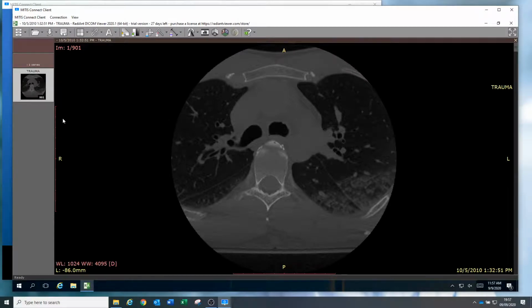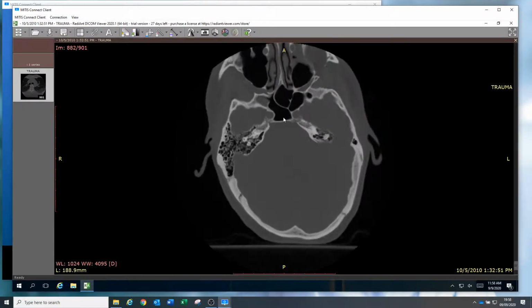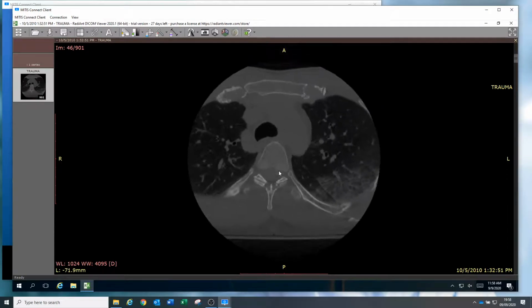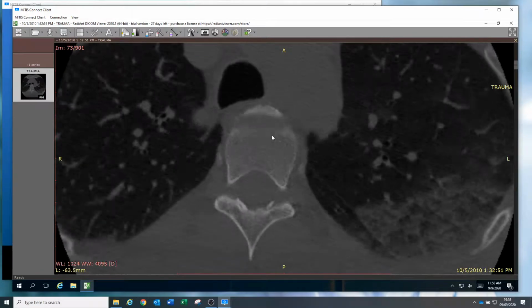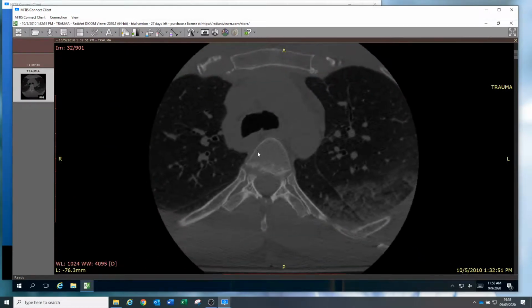With the CT scan now fully loaded into the PACS viewer, we can now start scrolling through the different slices of the CT scan, noting that the images are crisp, clear and highly responsive. We can see also the visual acuity, the fidelity and the lossless aspect is running really well, and it's correlating to what the user would experience when reporting within the trust.